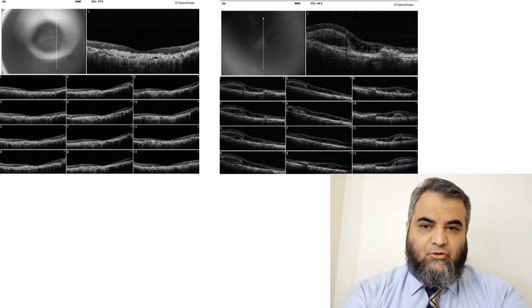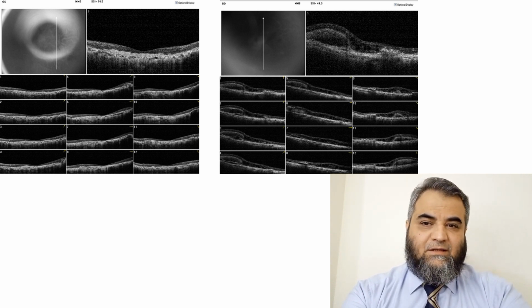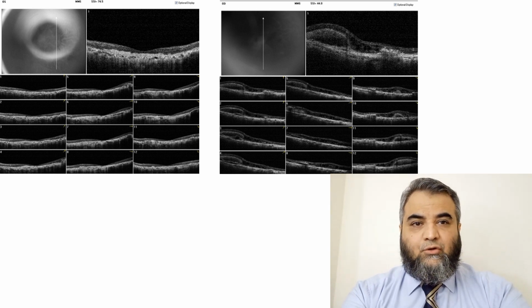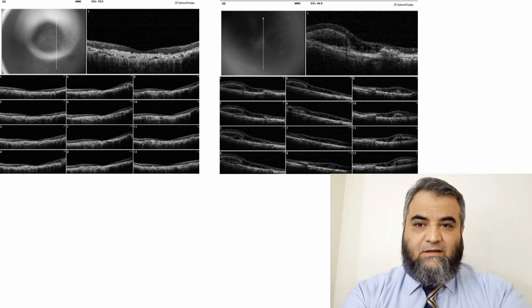They have been shown in the right slide, where you can see a slope, a plateau, and under it a hyporeflective area. These are the areas of the subretinal fluid. And if you go a little laterally, you will see intraretinal fluid. So it means this patient now again has activity. The choroidal neovascular membrane, which was inactive, has started showing activity again. It is leaking, and this now needs treatment in the right eye.